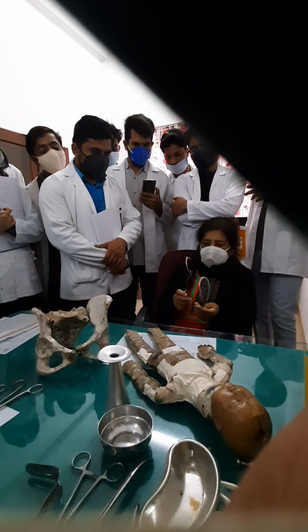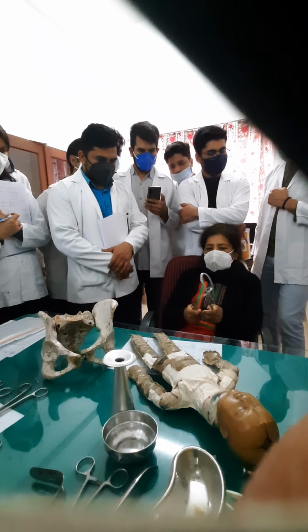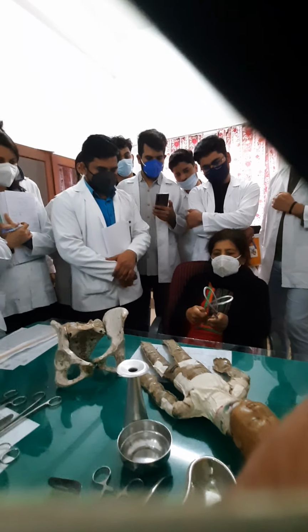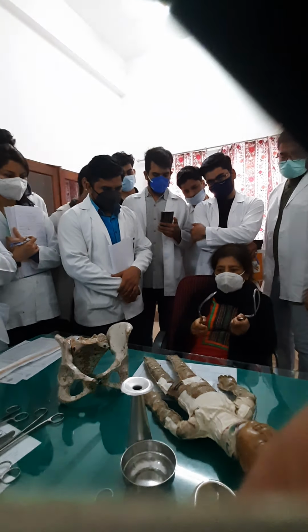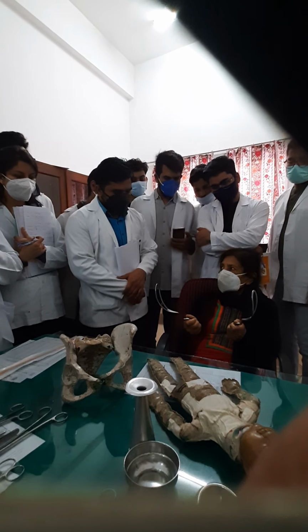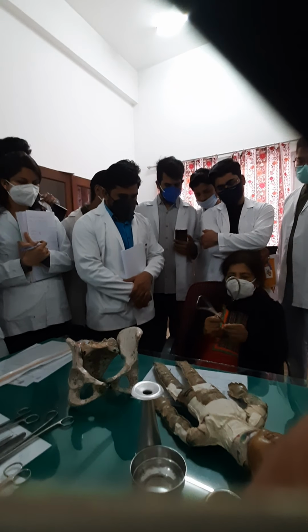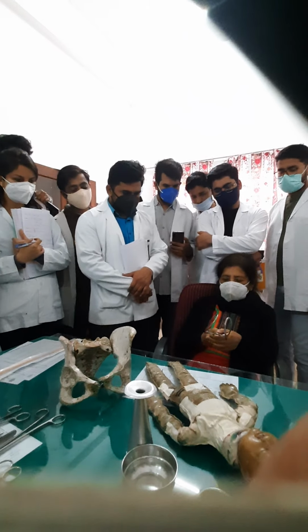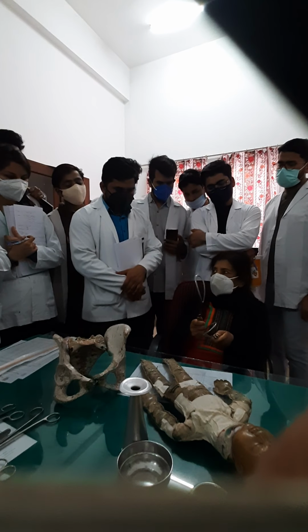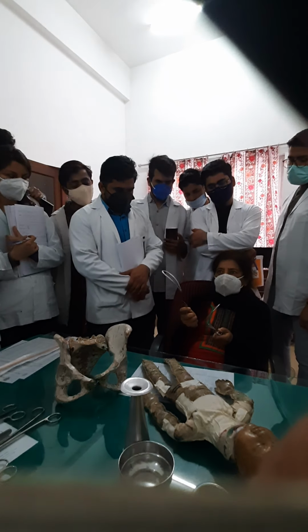How do you know which is left blade? So it's like this, no? Whichever blade shows concavity inside, pelvic curve forward, tip upwards, you know? So this is the left blade and this is the right blade. So which blade do you put first? Left blade first, okay? Left blade first, then right blade. Then while removing, the right blade is removed first.